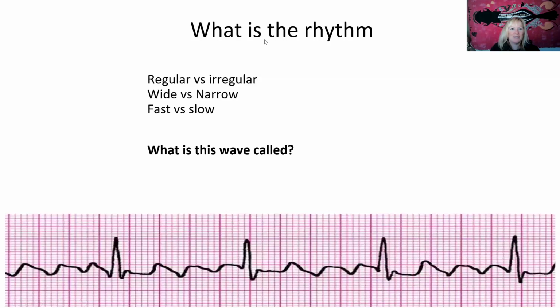Now, this is the one I was going to present next for you. What is the rhythm here? I love that you said PE, Allison, by the way. KJ, figure out your why. Yes, this one is a flutter. So how do we know that this is atrial flutter? And Michelle says all the energy drinks. And yes, Tanya, TSH, I agree. This is flutter. Yes, been duped on that before.